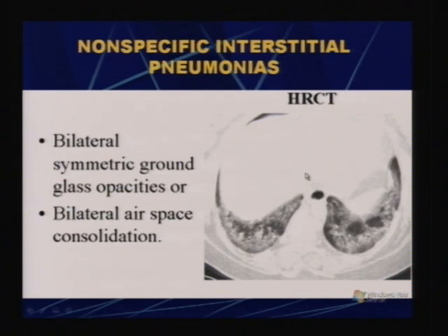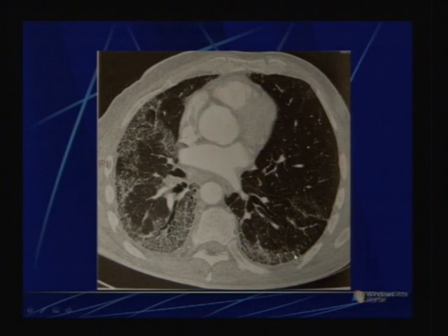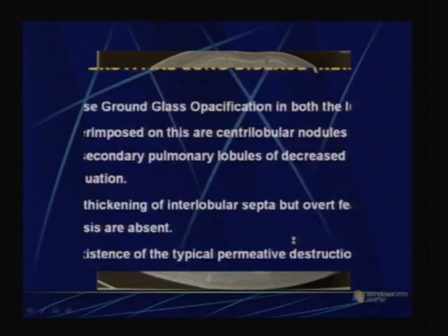You can see here again a patient with bilateral diffuse involvement. This is mainly a ground glass pattern. Now this is a picture where you can see a subtle ground glass appearance. Along with this you can see a reticular pattern in the basal region, but there is an asymmetrical distribution of this reticular pattern, as against usual interstitial pneumonia, where you see a bilateral symmetrical pattern.